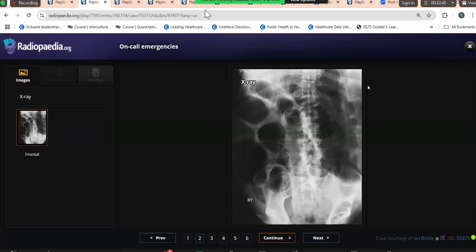Candidate 4, can you see the X-ray abdomen? Yes, ma'am. So please comment on the X-ray abdomen first. I've been provided with an X-ray abdomen of a skeletally mature patient in which the most striking abnormality I can appreciate is that there are multiple gas-filled dilated small bowel loops throughout the abdomen. I also appreciate that there is a large bowel loop which is dilated and fluid-filled in the left hemiabdomen.